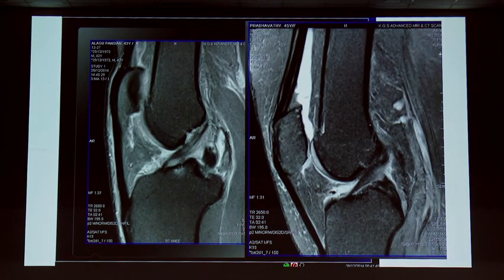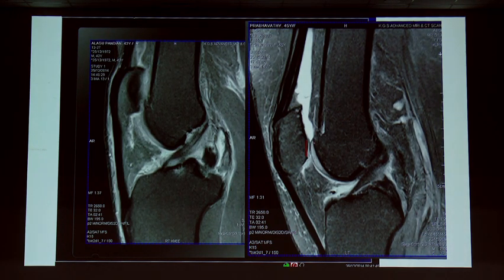And the patella alta, which I told clearly, you should have. This is normal. You can see the articular cartilage and the trochlear cartilage, and 1/3 will be there. And here you can see how much it is above. And another way of measurement is the TL by PL measure. It is the tendon length and patellar length. Measuring this, we can say confidently what is happening.